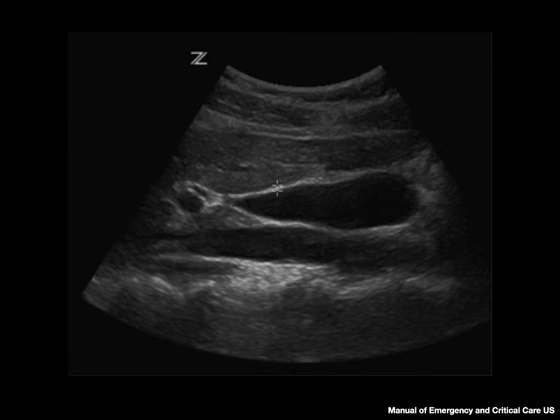One more example of the exclamation point sign. The MLF is shorter in this example, but the hepatic artery and CBD are clearly visible on top of the portal vein. The IVC and spine run longitudinally deep to the gallbladder in this image.